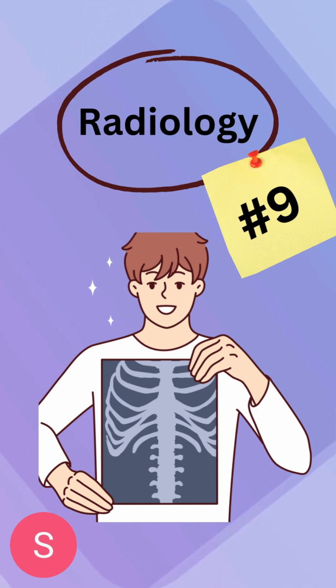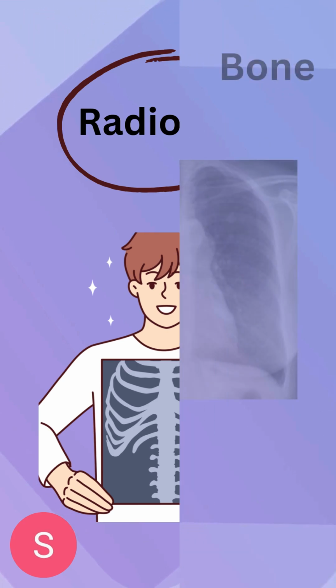Alright, so today, just like any other day, we're going to be doing a case study on a very specific type of condition. We're definitely not going to be able to cover all of these conditions, just so you guys know. It's just the main ones, and from there, we can understand what causes lung collapses and predict what's going to happen when something is slightly different, and it's mostly just reading up on knowledge as well. So let's get right into it.